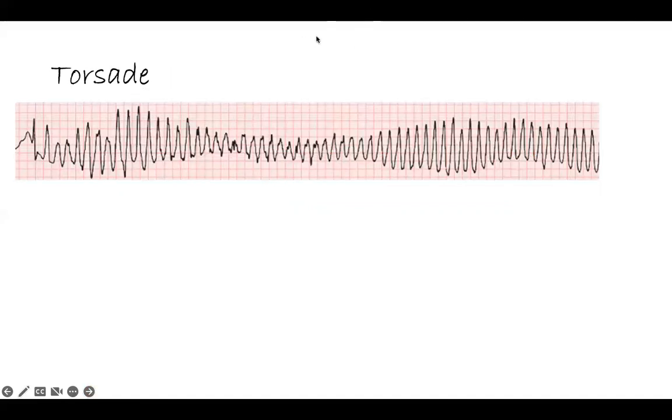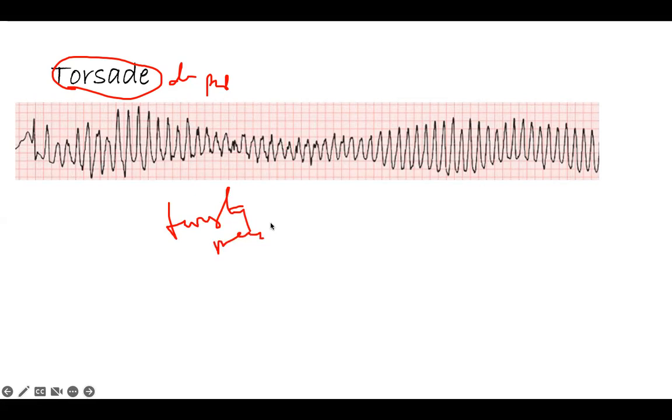Then there's this one, the board like very much, is Torsades de Pointes, some French guy, I don't know whether he's French, but that's his name. So the name is something that is twisting, or meandering. It's moving around. It looks like the ventricles.